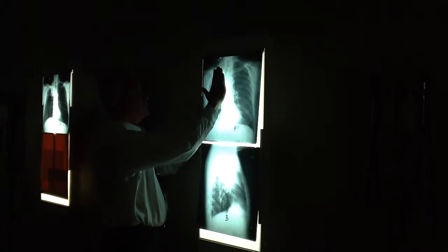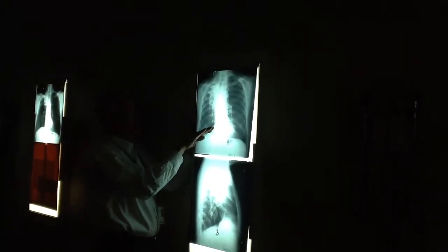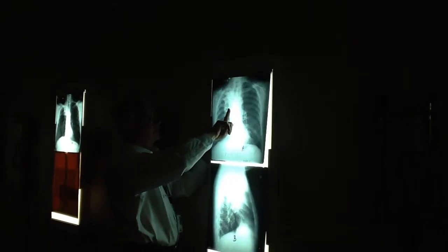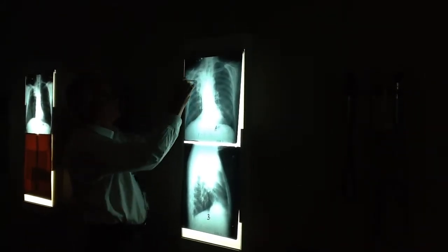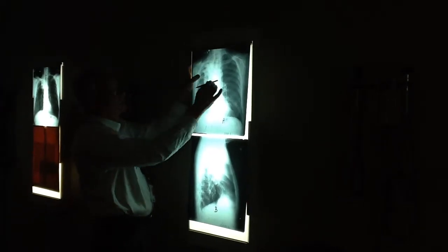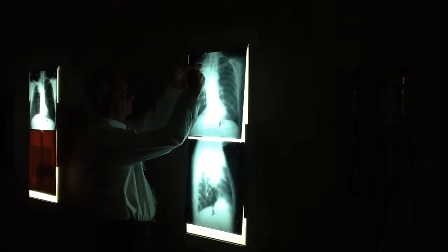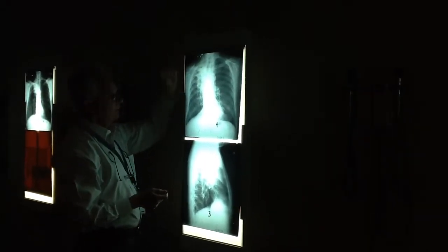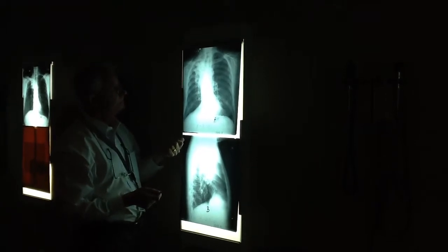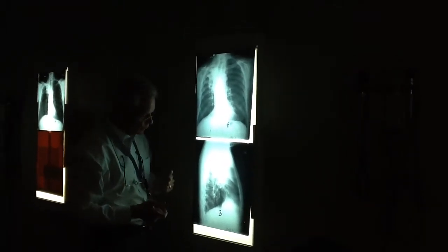So we've got an increase in density, trachea moving toward it, a slight elevation of the diaphragm. Yes, definitely elevation of the hilus. You think the ribs are a little closer together than they are over here? Yeah, so we've got rib interspace narrowing, and it's all happening in the upper right lung field, and it's an adult, right? It's an adult. So we have to be thinking tumor.